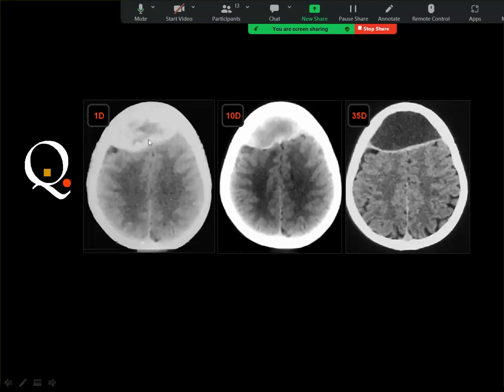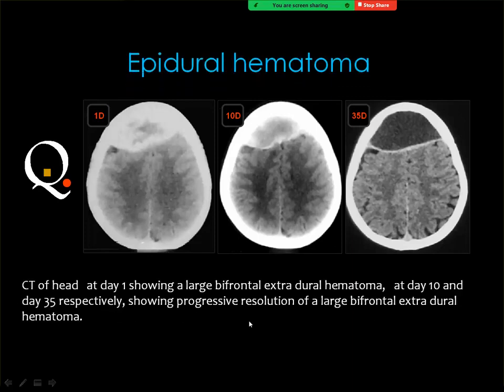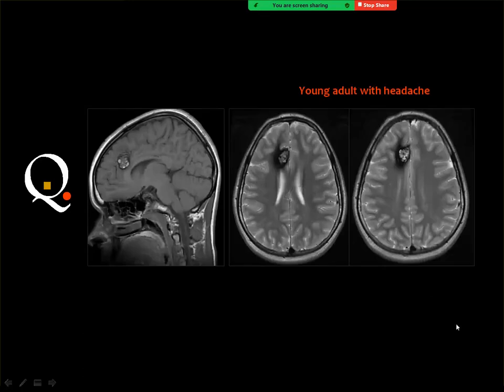The hematoma was bright in the CT scan obtained in the first day, then the density decreased by day 10 and is now a chronic epidural hematoma. This is not usually the case for epidural hematomas to pass the way from acute to chronic, because an epidural hematoma is present in a tight space, and it produces significant symptoms. Then it is evacuated before being passed into the chronic phase.